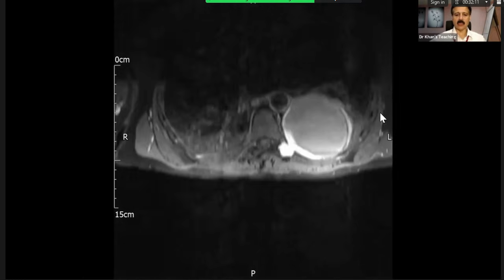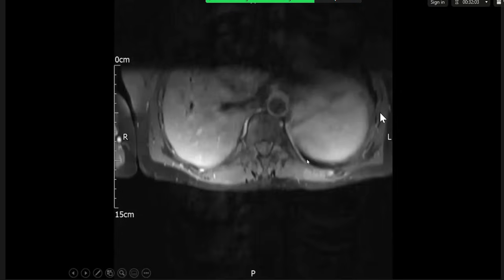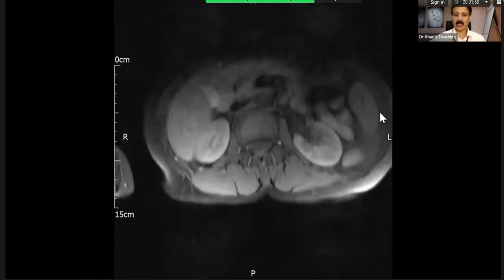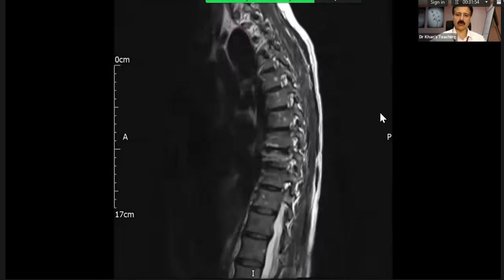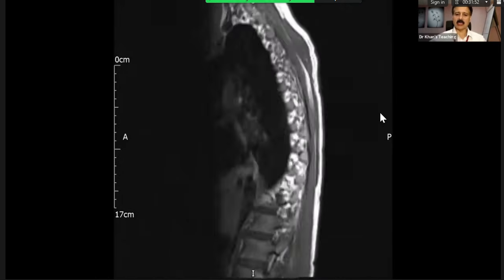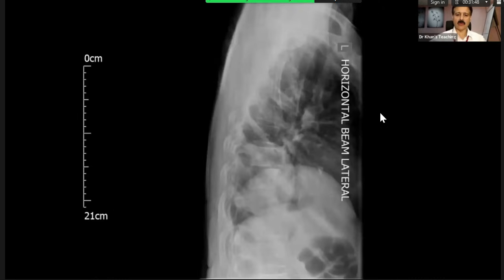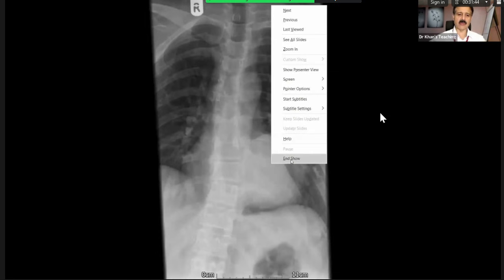Just like, think like an endometrioma, and now you can see that the periphery is enhancing. So point to remember is that neurogenic tumors can have cystic component. So this was a neurogenic tumor. But again, the emphasis, if you see all of the cases which I have shown you, is subtle finding and then characterization on MR. So that is what exam cases are about.